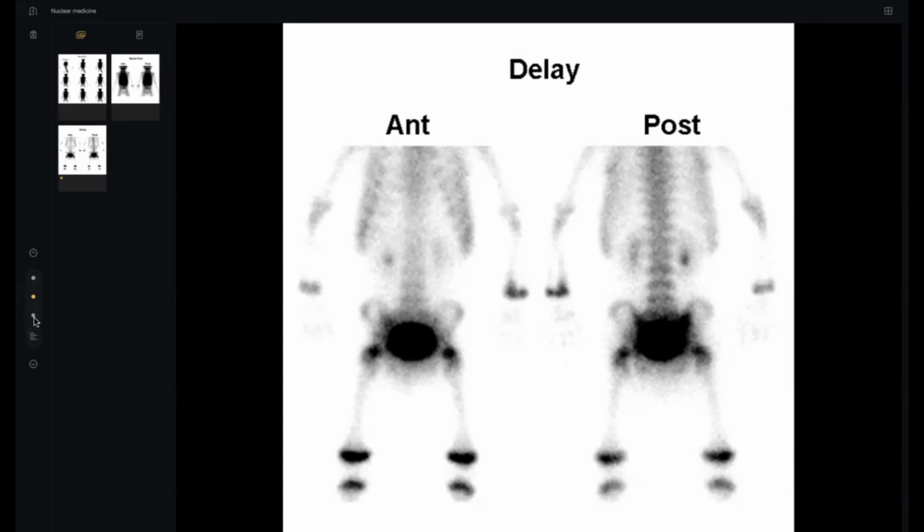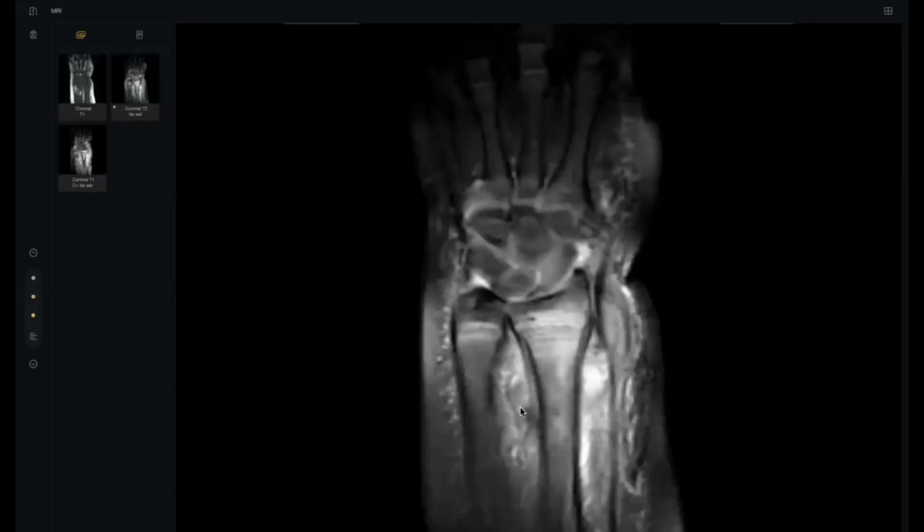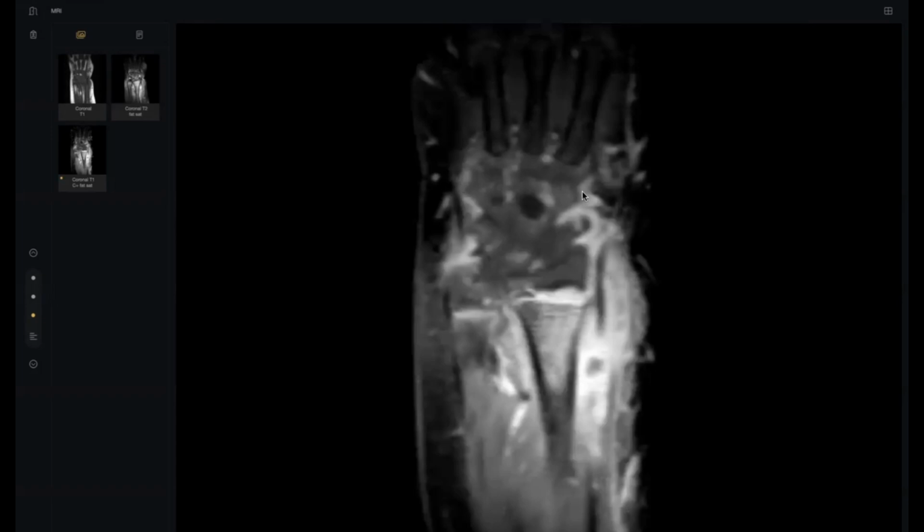Then after we do the MRI, we find extensive abnormal soft tissue edema and bone marrow edema. So this is not tumoral. Why? A tumor would be more localized. It may be associated with some edema, but not like this. I see markedly ill-defined enhancement involving the bone marrow and soft tissue. This is a case of osteomyelitis. Thank you, doctor, so much.